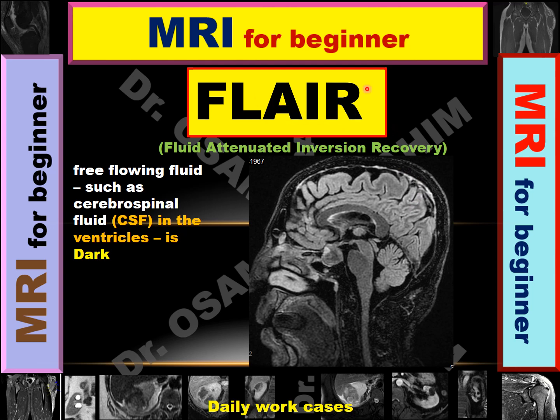Another MRI sequence is the FLAIR image, which represents fluid attenuation inversion recovery. This suppresses only the flowing fluids, like CSF flowing in the ventricles, subcortical sulci, CSF spaces, and also in the spinal canal. Flowing fluids are suppressed by this technique. However, fluids which are not flowing appear as a bright signal in the FLAIR image.